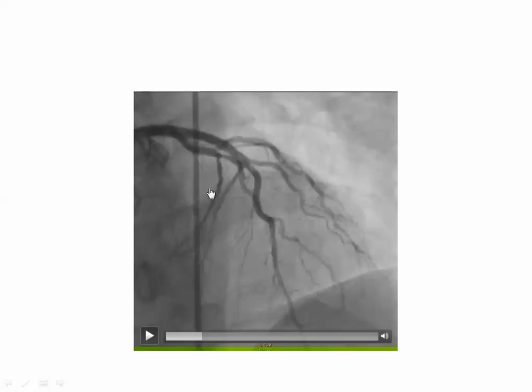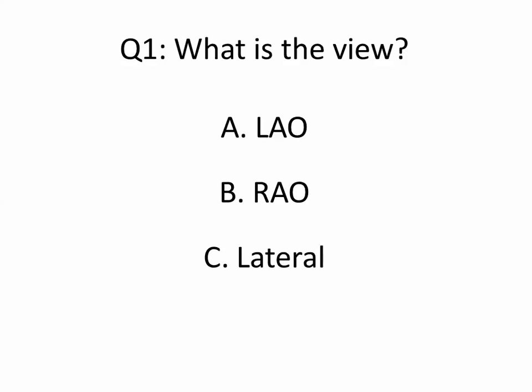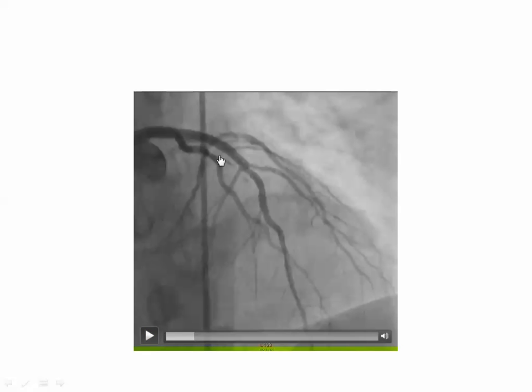And where is the LCX? Can you comment on the LCX? No, it's overlapped. This is the LAD, these are diagonals, and this is the LCX.